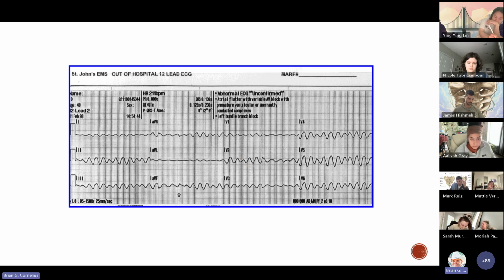Does that clear up the bifascicular portion? Okay. Kyle asked, so V6 analysis is not required for bundle branch blocks, just V1, correct? So if you use the technique I showed you, all you have to do is look at V1. And like I said, it's as simplified as possible, but you can look at that and use it just to make your bundle branch determination for that. And that's just figuring out right versus left.